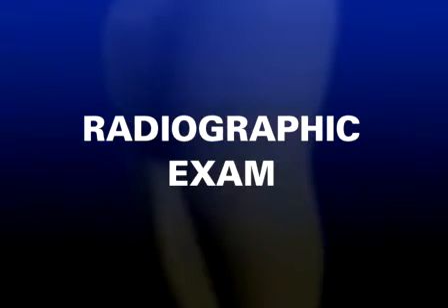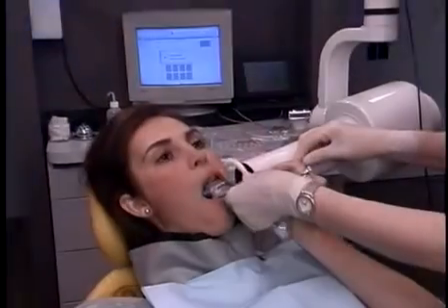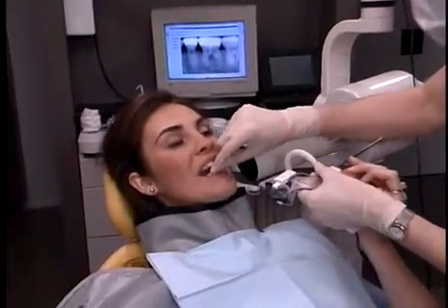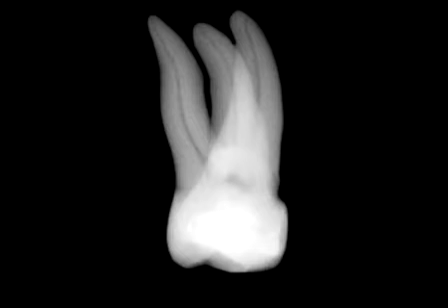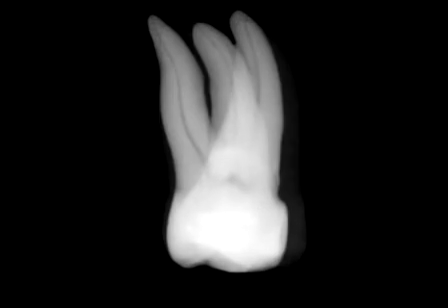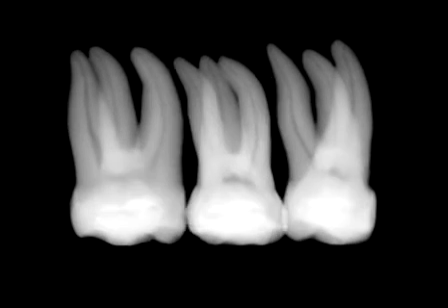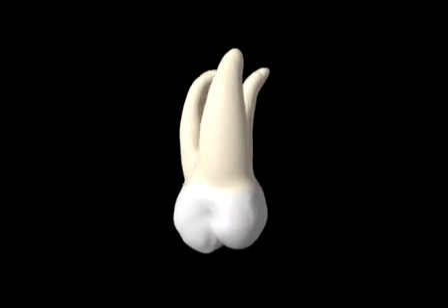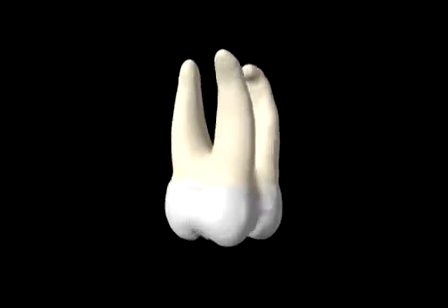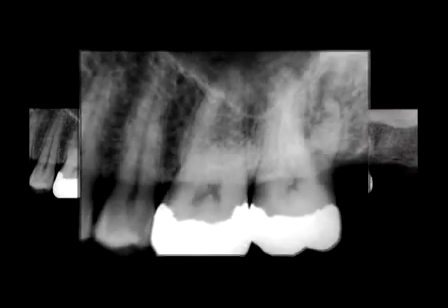The third stage of endodontic diagnosis is the radiographic exam. Clinicians should take 3 well-angulated radiographs prior to initiating treatment in order to better appreciate the three-dimensionality of any given tooth. From an endodontic standpoint, preoperative films should include mesial, distal, and straight-on angles. These views will better prepare the clinician for root canal treatment. 3 films in combination are more valuable than a single film alone, and give us important information as to the buccolingual dimensions, concavities, and extra canals.